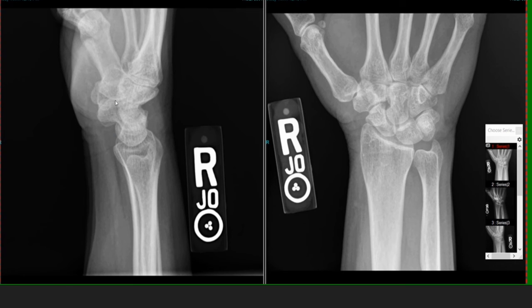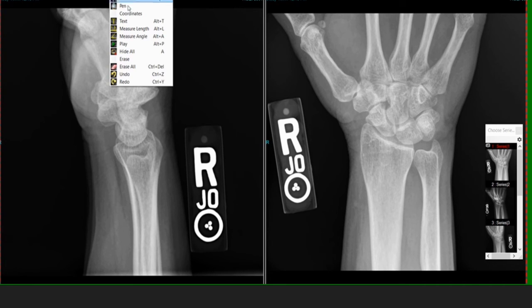And superimposed in here are some of the other carpal bones, somewhat difficult to distinguish. I see here the pisiform bone on the ulnar volar aspect of the hand, and then here are the metacarpal bones.